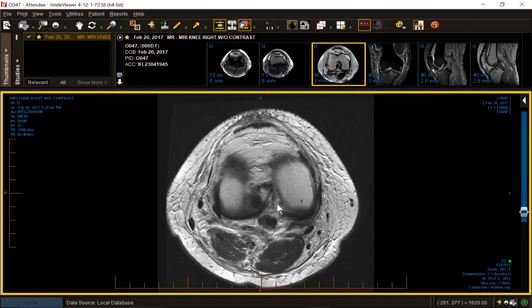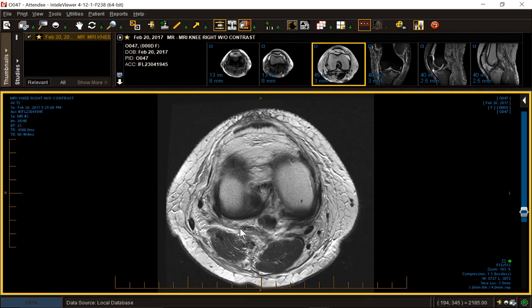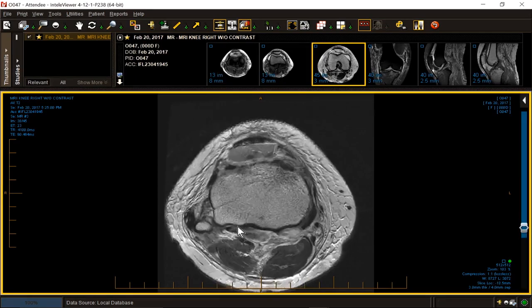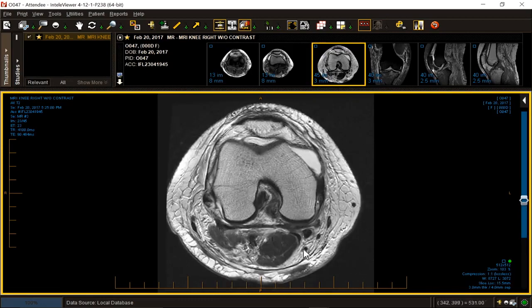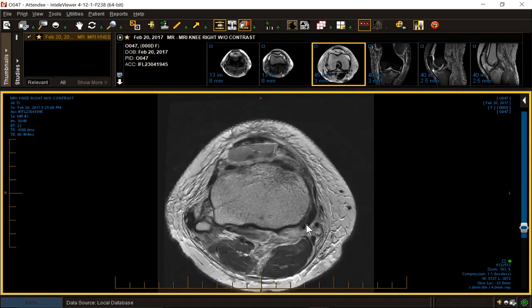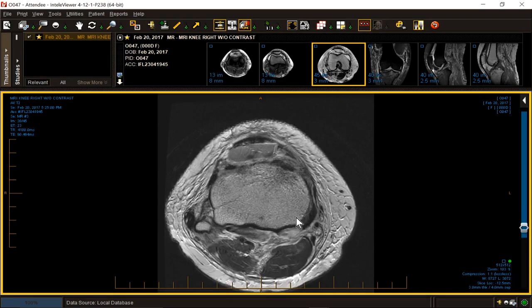How about our posterolateral corner and our posterior capsule? There's our capsule. It is not continuous. Looks better here. Looks a lot worse here. Let's check out our semimembranosus. There's some swelling around it. Sort of tough to actually see it attached to the bone. I'm a little concerned about it. We'll come back to it, though, in another projection.